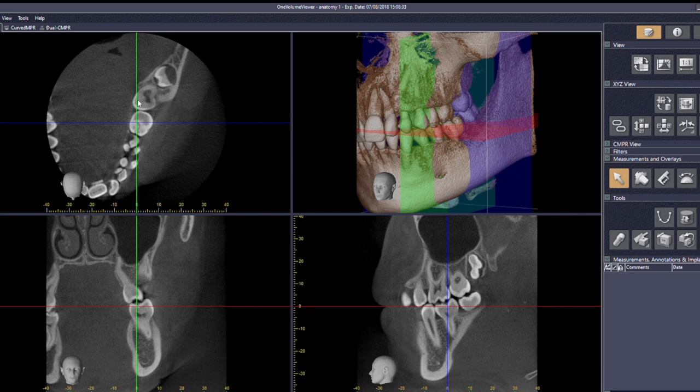The same thing up here, we haven't got a red line. So we look, the red line across here cuts across the teeth. You can just see it's just between the crowns of the teeth, which is why we get this picture of some upper teeth and some lower teeth. And then finally the blue, you can see there's no blue line here, so this blue line is represented here. So we've done the axial, coronal, sagittal, and we've done the volume rendered view, and we've sorted our histogram.